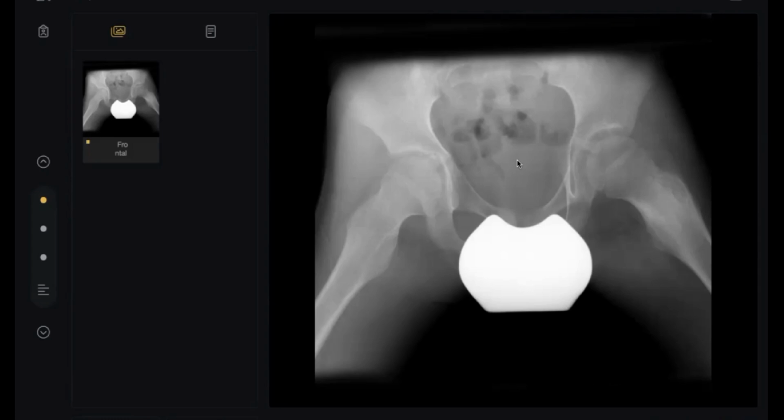My differential diagnoses are those of a non-aggressive lesion. I will correlate with the patient history to see if the left hip pain is especially at night, and if it is relieved by non-steroidal anti-inflammatory drugs. The top differential diagnosis will be those of osteoid osteoma.